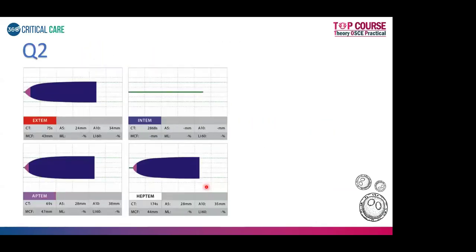Can anyone answer this? It's very simple. Heparin effect. Excellent. Sir, why do you say heparin effect? Sir, the CT is very long in the INTEM while it's normalized in the HEPTEM. Excellent.